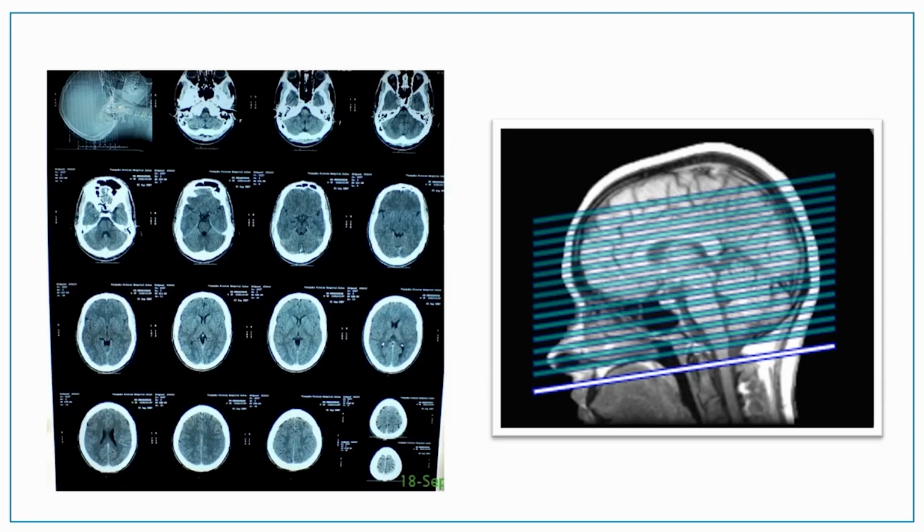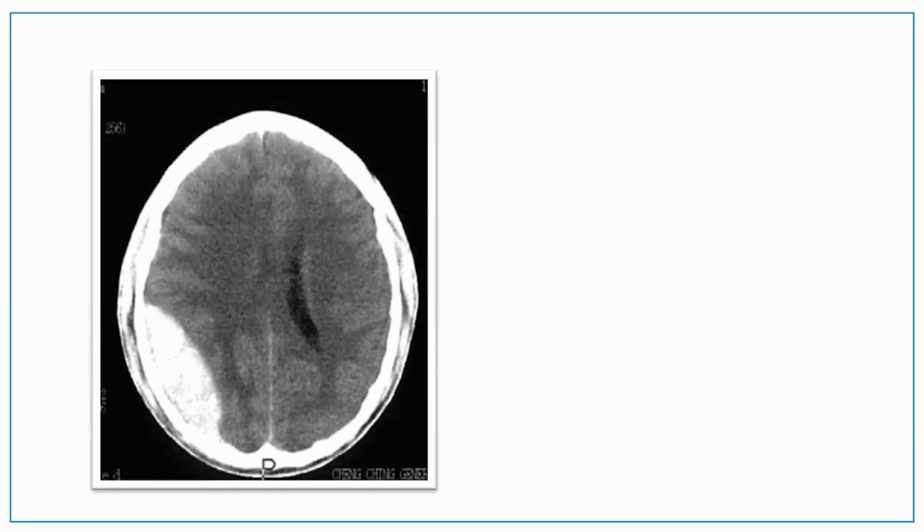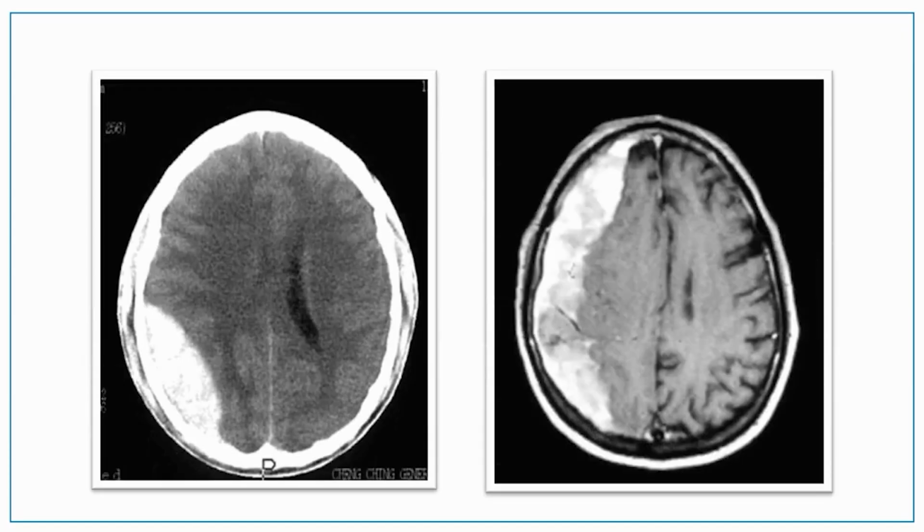Within 30 to 40 seconds, you can actually identify different structures, and if there are any abnormalities in any particular area, you can very easily identify them. I am going to show you a couple of abnormal slides here just for understanding's sake. In these two images, there are a couple of bleeds. One is an extradural hemorrhage outside the dura because it's biconvex, limited by dura, lens-shaped. The other one is an SDH, subdural hemorrhage, under the dura, and any bleeding under the dura is going to cross your suture lines. So it's going to look crescent-shaped, right?